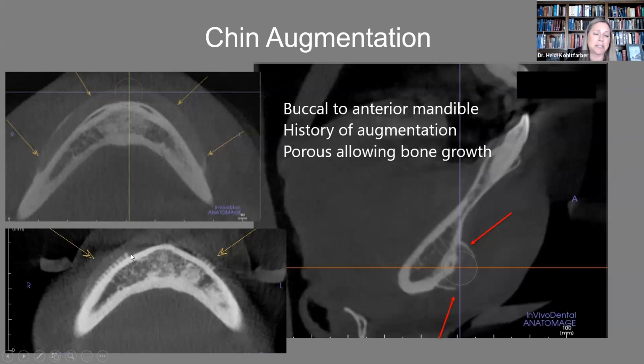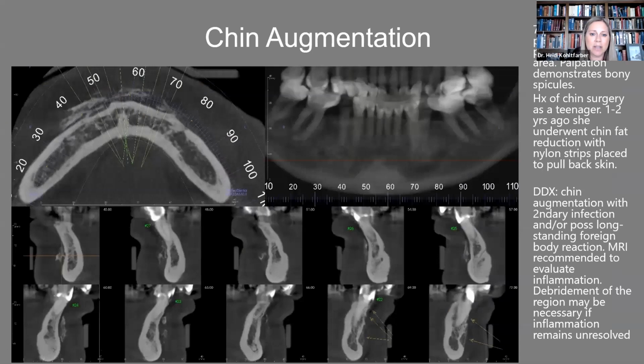So it's doing exactly what it's supposed to be doing. But sometimes our patients don't really tell us exactly what is occurring. So this was a great case. This one came in, a 72-year-old female, presented with pain and swelling in the lower left area. Our clue when we come in, of course, is that this is bilateral and crossing the midline.